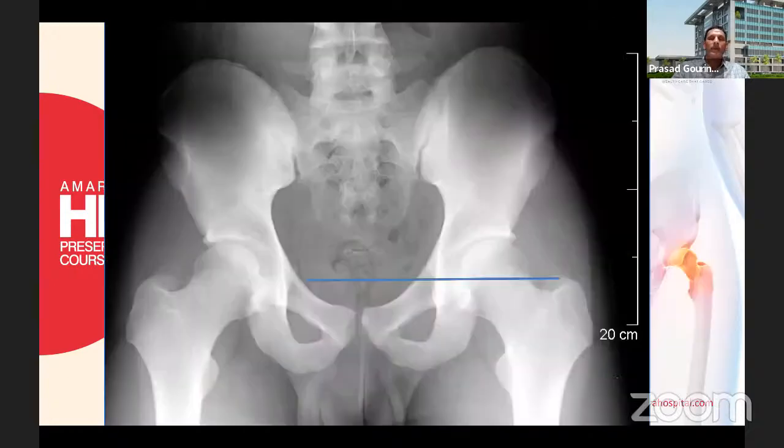Now on the femoral side, we look at the femur. We're drawing a horizontal line from the tip of the trochanter. This tip of the trochanter should be at the level of the center of the head, ideally. If it's above, it's a sign of maybe coxa vara, and if it's below, it's more like coxa valga. Here's a weight-bearing axis going up.